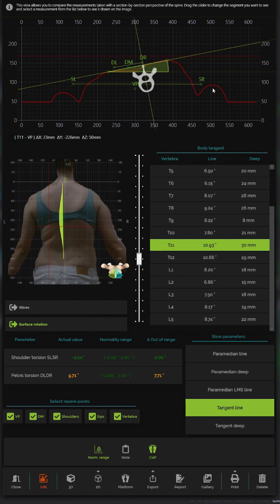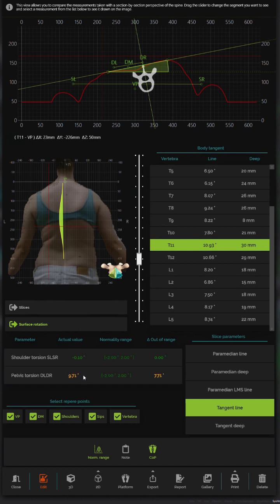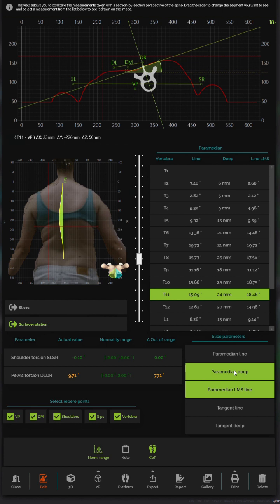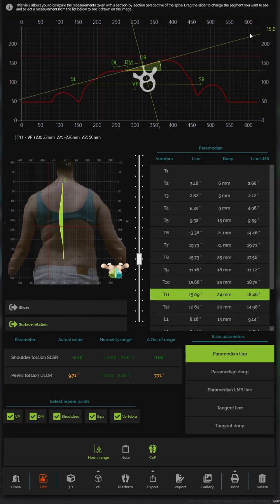And then the top image is almost a cross section of what's actually happening at those levels, showing the rotation out and away from the heart, pushing those right hand ribs back, which is creating the rib hump and a right scapular winging.